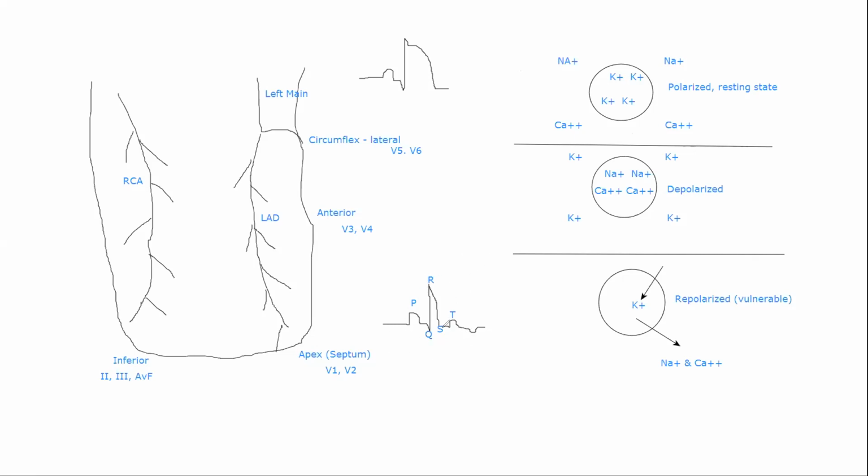part of the EKG. So the P wave is atrial depolarization. The QRS is ventricular depolarization. And the T wave corresponds with repolarization when a heart is vulnerable. And that's going to become important when we talk about code management. Yeah, so our heart is vulnerable here during the T wave because it corresponds here with repolarization. So what we're actually seeing when we're looking at these waveforms is what's happening to the ions in the cardiac cell. That's what we're seeing on the EKG.